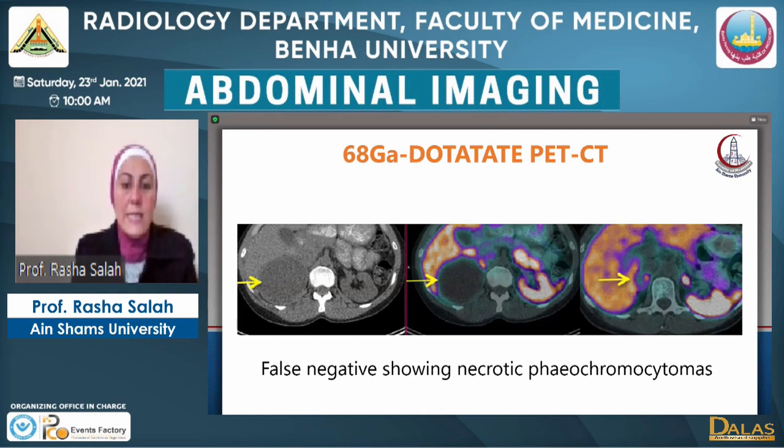And so this indicates not only the diagnosis of the paragangliomas, but it also gives us an interpretation of the histopathologic and metabolic activity of this tumor.